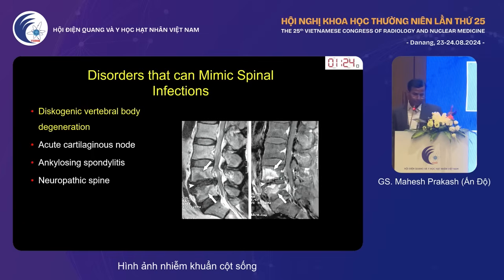As the previous speaker also said, sometimes it can be difficult to differentiate degenerative disc disease and infection. In our day-to-day clinical practice, this is a very common dilemma. You always feel a dilemma whether you are dealing with infection or degenerative disease. So there are some points which can suggest that we are dealing with infection and not disc disease.